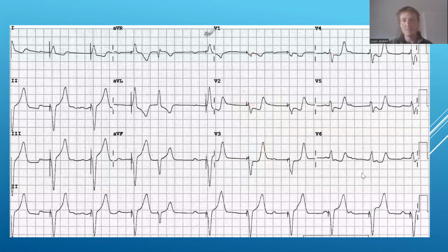So this is the kind of person that if they're presenting with ACS and you see an ECG like this, you should really be going to the cath lab. And if you see an ECG like this in an older patient who maybe has some non-specific chest pain, but you're picking out these changes, I think that should hopefully prompt you to dig a little deeper and tease out some of those symptoms of ACS so that you can justify taking them to the cath lab under that left bundle branch block pathway. Because these patients, on the balance of risk, are likely to really benefit from having angiography early. But cool.